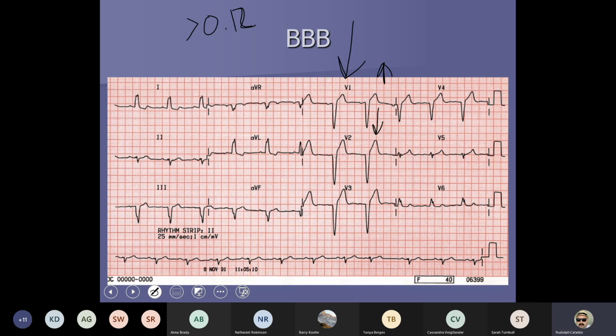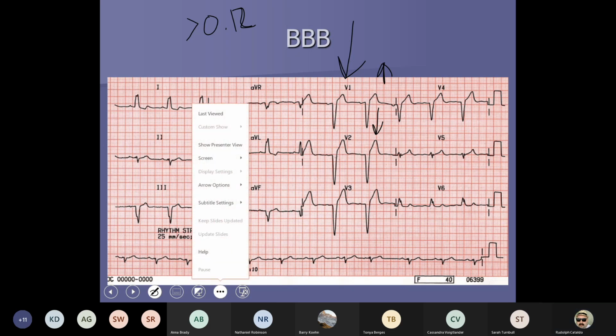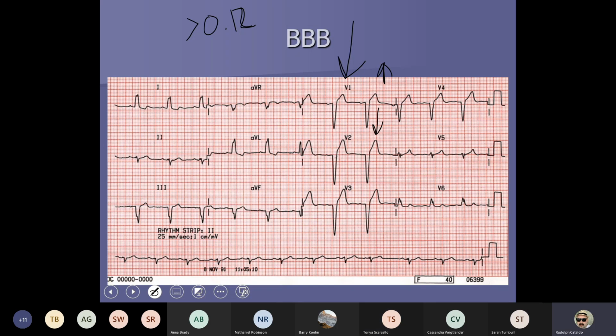Think about if I was to turn this 12 lead. If I was to grab it in my hands and turn it to the right, so my left hand is now holding the top of the strip and my right hand's holding the bottom. You see what I'm saying? I wonder if I can rotate this. Counterclockwise is what you're saying. Yeah.